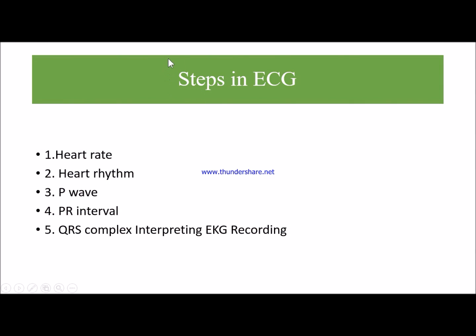What are the steps in the ECG? There are several steps in the ECG. Whenever we are taking the ECG of the patient, we need to know about the heart rate of the patient, whether it is normal or abnormal. We need to know about the rhythm. As we read in the last slide, the RR interval is helpful to denote the rhythm.